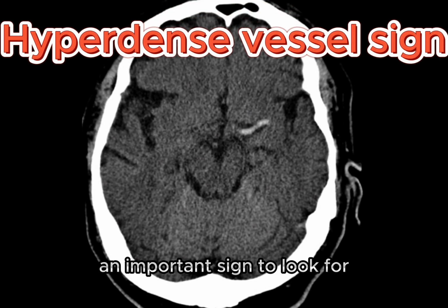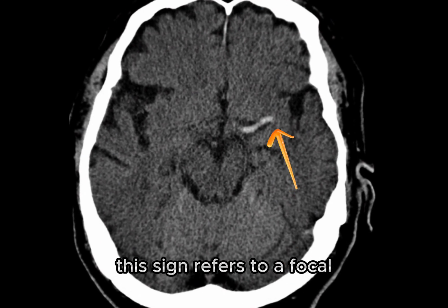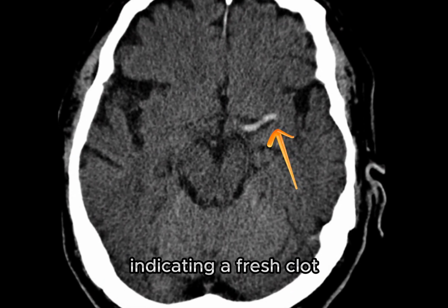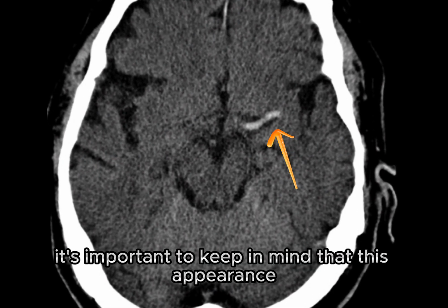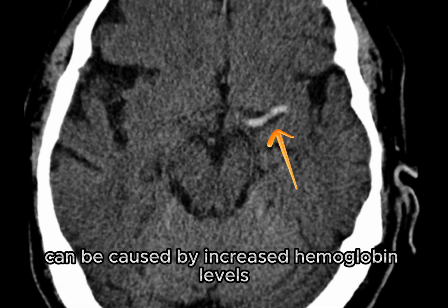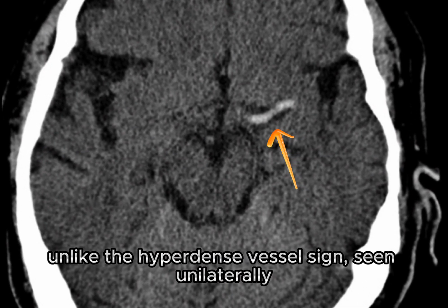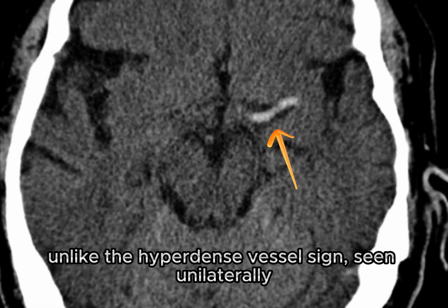An important sign to look for is the hyperdense vessel sign. This sign refers to a focal increased attenuation of a vessel indicating a fresh clot. It's important to keep in mind that this appearance can be caused by increased hemoglobin levels, but that would be seen bilaterally, unlike the hyperdense vessel sign seen unilaterally.